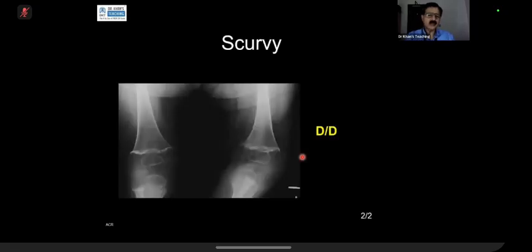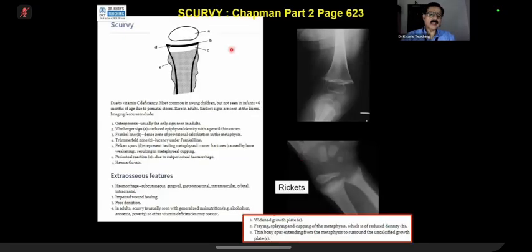These findings are suggestive of scurvy. Okay. Now let's repeat the findings and then we'll come back to the film. Please remember scurvy, as I told you in the beginning, is by definition an osteoporosis. The osteoid is lacking, and it cannot happen before 6 months of age, and that's a viva scenario. Don't consider it in the differential if you find, let's say, a periosteal reaction, things like that.